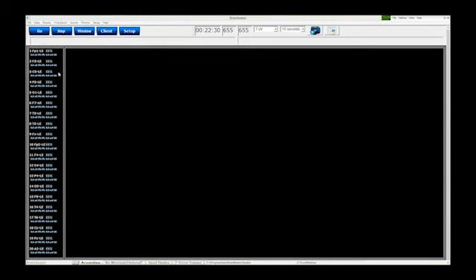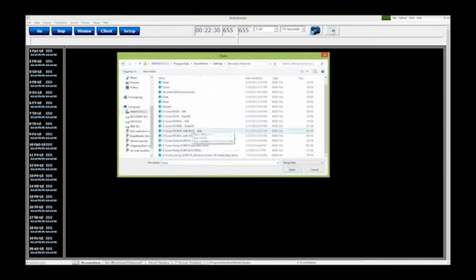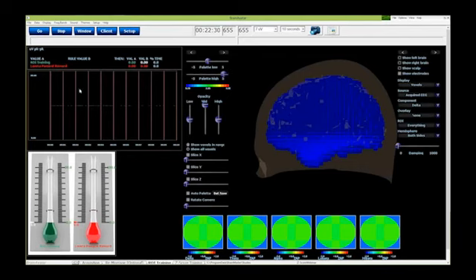If I go File, Import Settings, I go to my Discovery Protocols, you're going to see it right here: Z-scores PZOK-UL with ROI ANI. Basically the only difference between them is now you have the amplitude training that you're doing, and you're dealing with an amplitude metric going up and down. So you can either uptrain or downtrain.